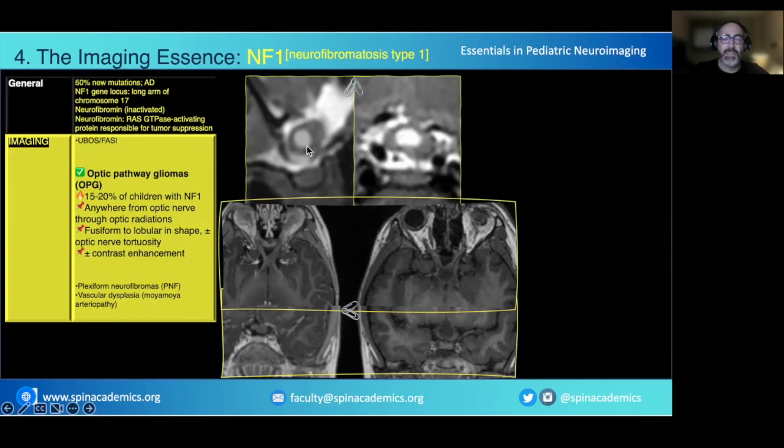The other typical lesion finding in NF1 is the optic pathway glioma, of which I have 4 examples here. This lesion is well defined, and it could affect the chiasm or only one optic nerve. The best sequences are T2 and STIR or some fat-saturated coronal sequences to see the alterations in the optic pathway. If you are doing a follow-up, you can consider whether you need to use gadolinium.